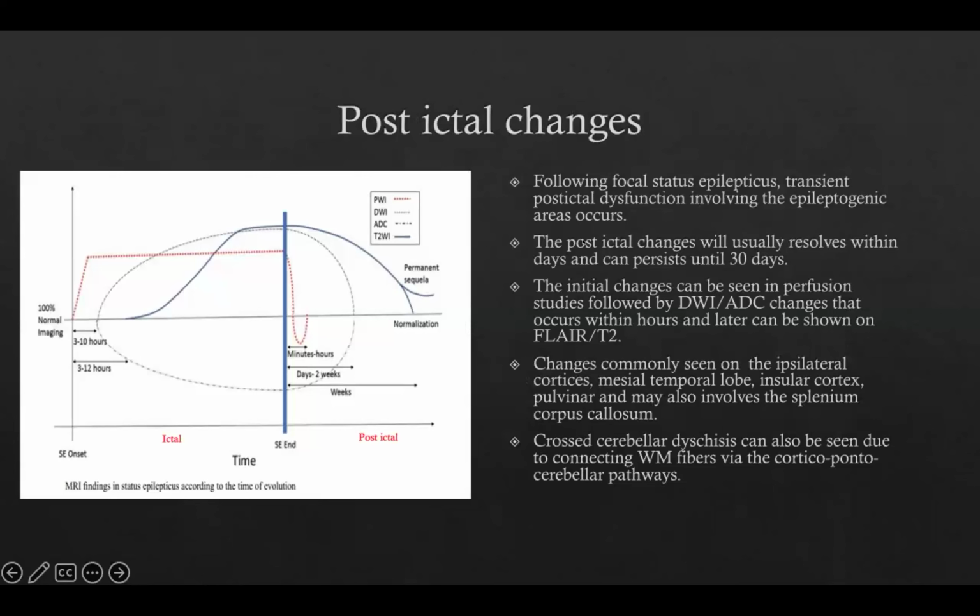Okay, and I think the last one is post-ictal changes. Sometimes it can be difficult even for us to differentiate whether this is solely post-ictal or post-ictal with associated changes, for example, post-ictal plus coexisting infection. Sometimes it can be difficult to delineate which is which. But post-ictal changes usually show resolution within days and can persist up to 30 days.